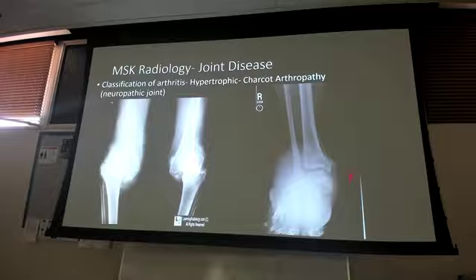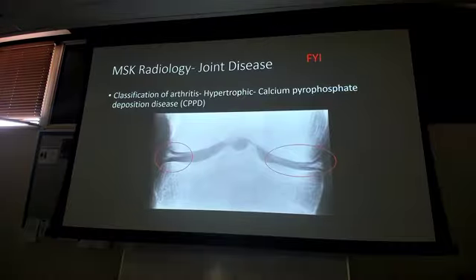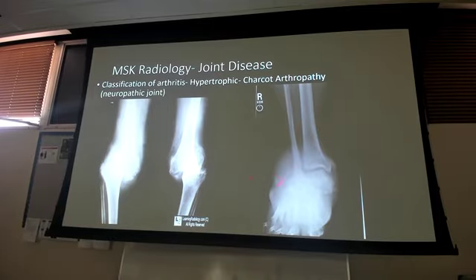They don't feel, look at how swollen, all that blurriness is because of how swollen the soft tissue is. Right in here. That's why you can't make any of that out. But I mean, look, your fibula is coming down way past here, almost looks like it's into the tarsals. They should not be able to walk like this. But they will walk right into your clinic.